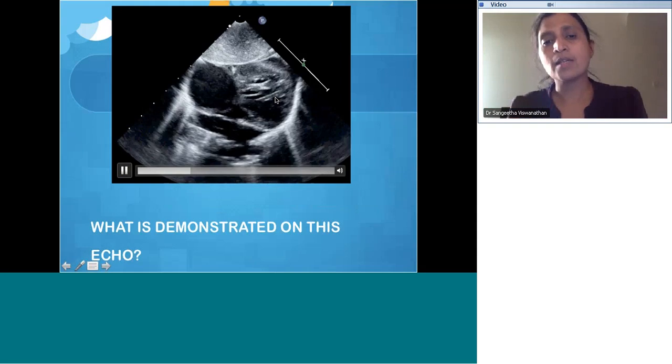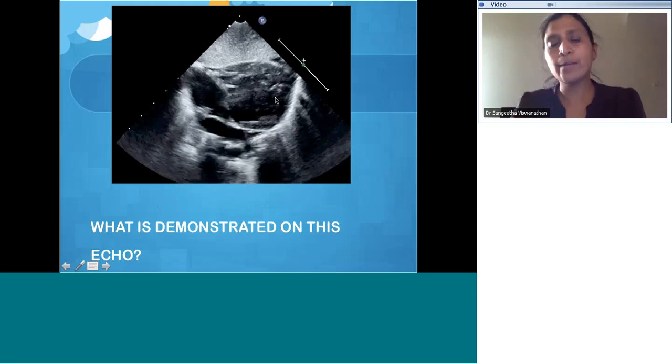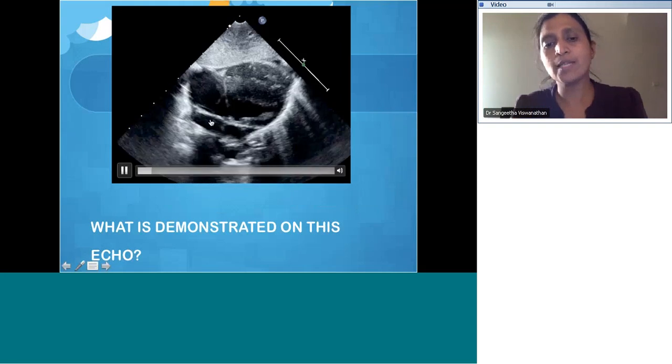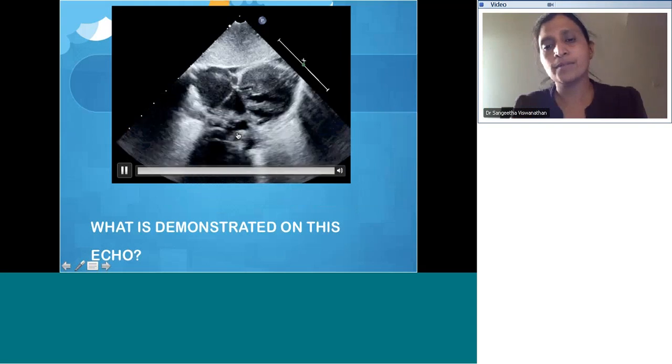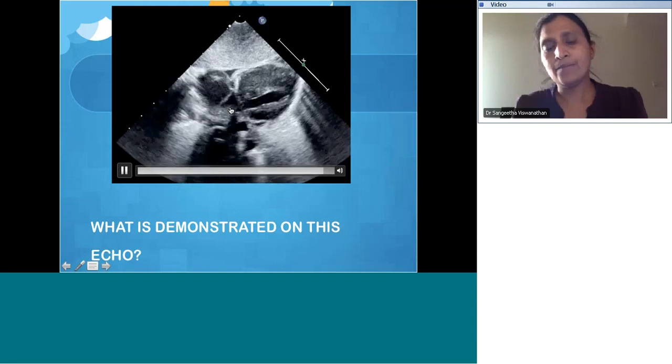So this is a subcostal view, okay, which is quite posteriorly tilted. This is the RA, RV. This is the LA. What is this?